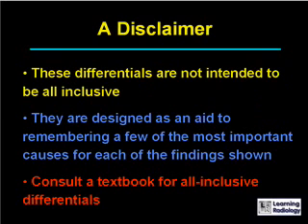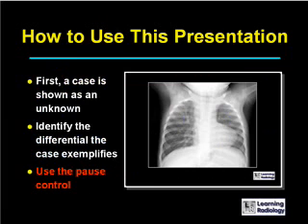These differentials are not intended to be all-inclusive. They're designed as an aid to remembering a few of the most important causes for each of the findings shown. The way the presentation works is that first a case is shown as an unknown. You identify the differential that the case exemplifies.